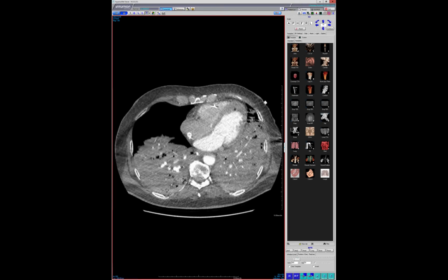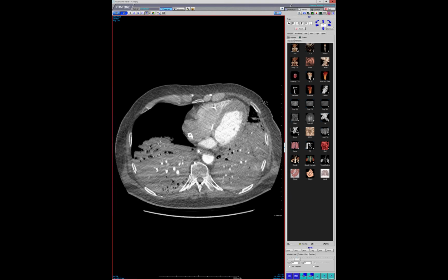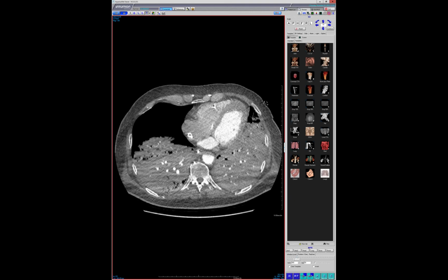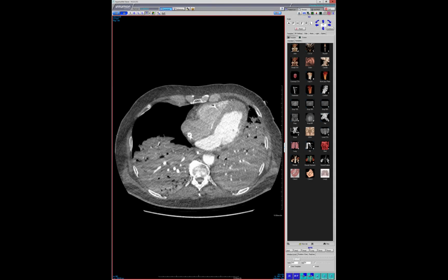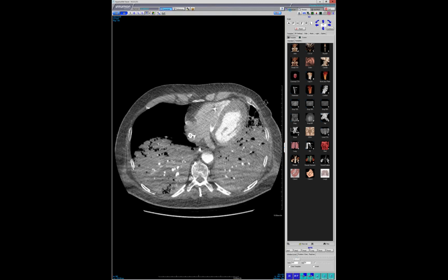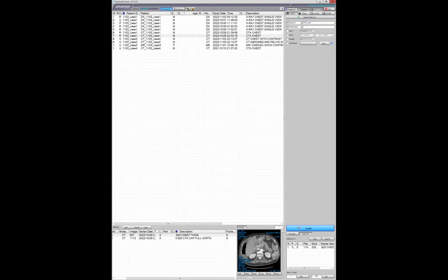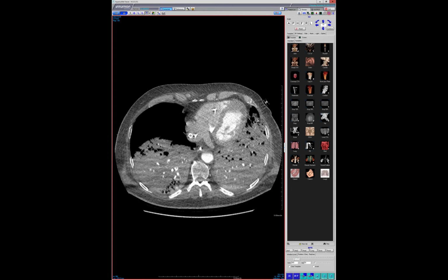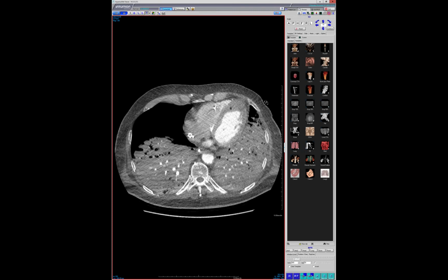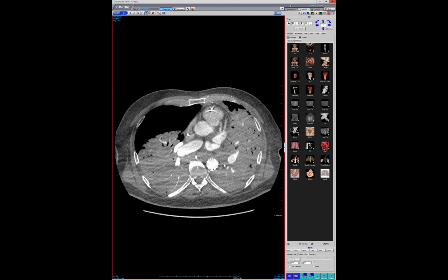They did put him on ECMO, but also what's interesting, just another thing to point out here, is he has all this non-opacification of the LV apex, which you're tempted to call thrombus because that's where he had his infarct. Actually, on the delayed scan of his abdomen and pelvis CT, there is a little bit of thrombus, but almost all this non-filling is just lack of filling from slow flow from that big LAD territory infarct.